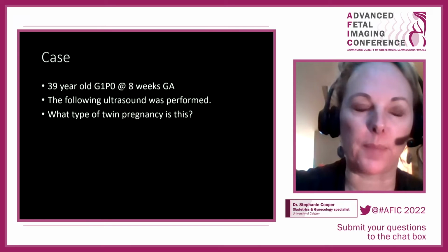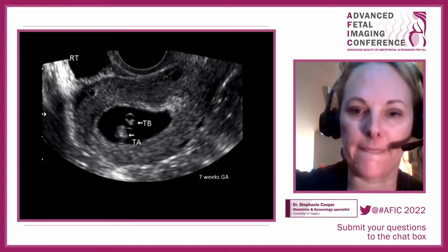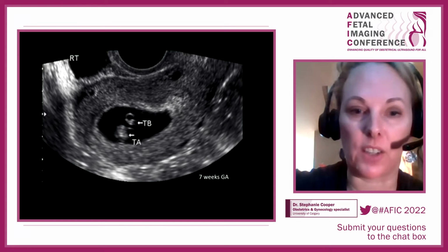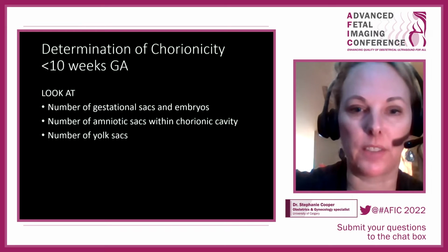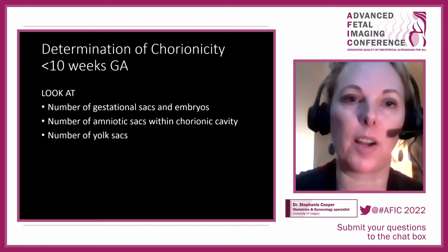Okay, so here's a case. A 39-year-old comes for an 8-week ultrasound. The following ultrasound was performed. So I want you guys to think, what type of pregnancy is this? Everybody look, and you can answer or talk to yourself. I'm going to keep that answer for just another couple of slides.